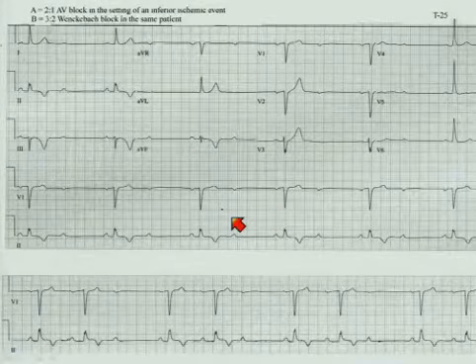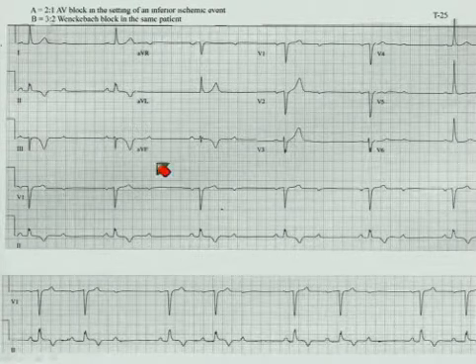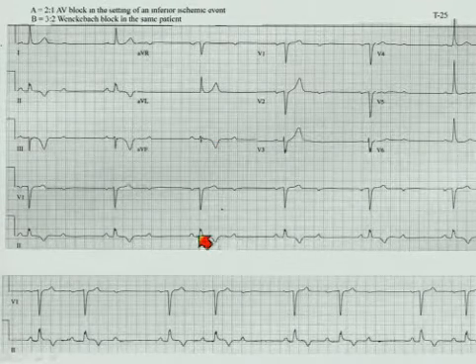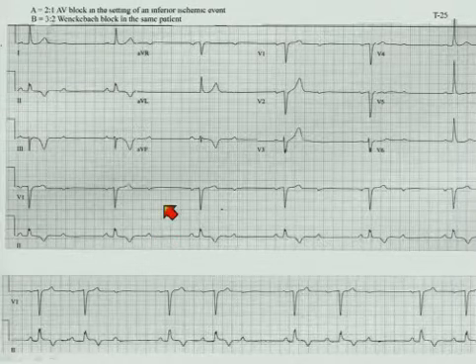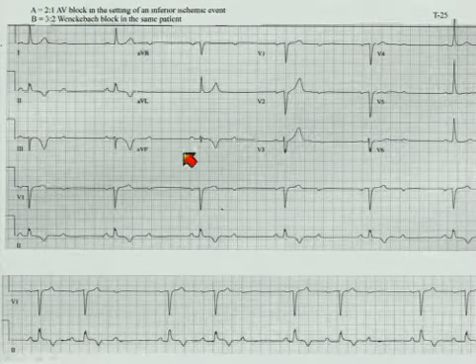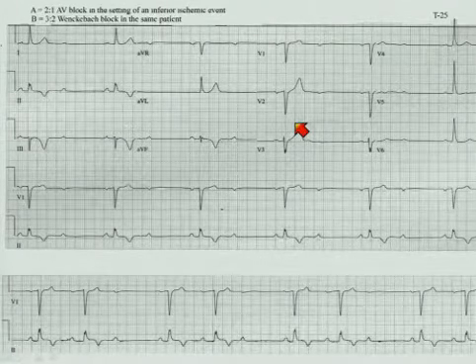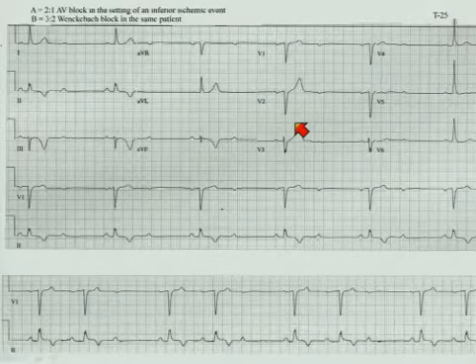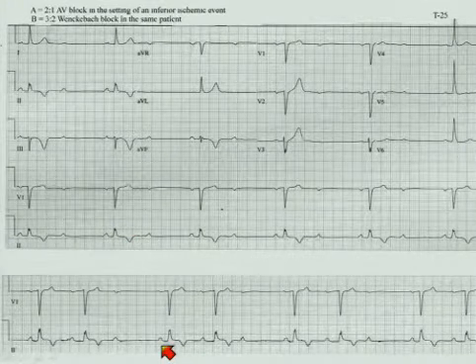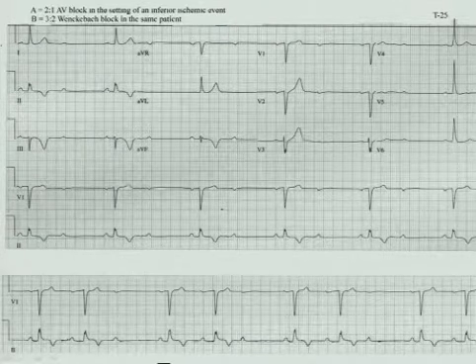Here's a patient with a 2-to-1 AV block. Just look at the top part of the tracing, please. A relatively narrow QRS, a patient having an inferior ischemic event, as you can see, and 2-to-1 conduction. So you don't know whether this block is occurring at the level of the AV node or below. You know, since it's an inferior event, it most likely is at the AV node, and since it's a relatively narrow QRS, that also suggests, and what this probably represents is a variation of a Mobitz 1 or Wenckebach, and if you monitor long enough, you can see that in fact that is the case, because it now goes from a 2-to-1 to a 3-to-2, and this is a Wenckebach pattern.